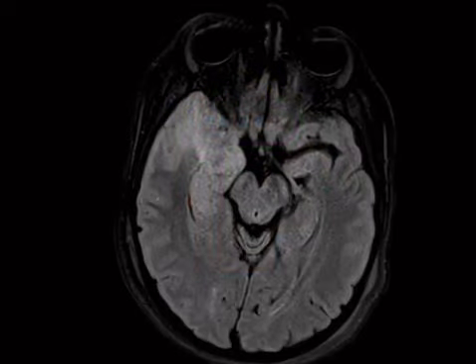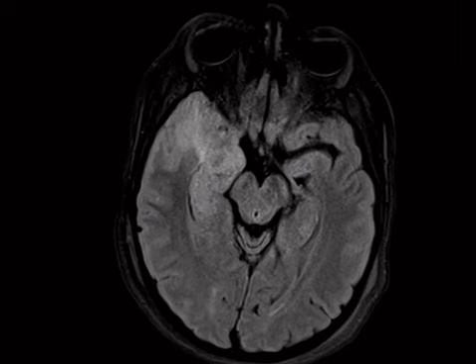Next case is another infection, of course, and what I'm showing here is what? Is that T1 or is that FLAIR? So how can you tell the difference? Look at the white matter. White matter's dark, so that's FLAIR. And we're seeing abnormal FLAIR signal primarily in the temporal lobe. Looks swollen, right? Look at this part relative to here. Swollen, right? So a swollen temporal lobe. Right away, you should be thinking about one diagnosis.